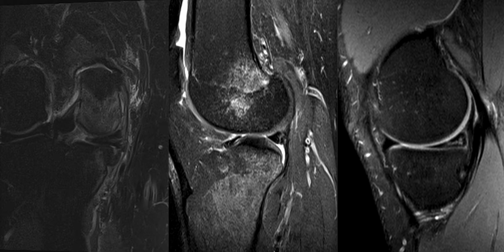I'm going to be talking about how to describe simple meniscal tears. And by simple meniscal tears, I mean tears that we see as a single line running through the meniscus. Tears which have multiple lines or where there are fragments displaced are called complex tears, and I'll talk about these in a separate video.